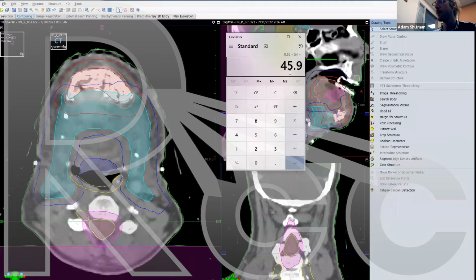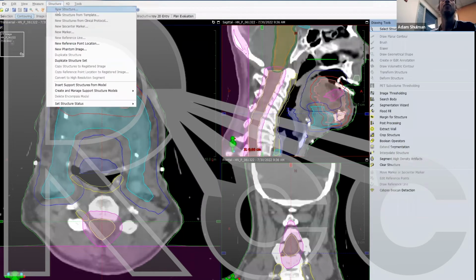So again, the same rules of thumb, divided by 60, 1 minus 0.765, times 100, so we need 23% fall off. So again, if we use our rule of thumb, 5% per millimeter, divided by 5, you'd need about 5 millimeters dose fall off. So if I put a ring all the way around both of these, I'll show you real quickly.